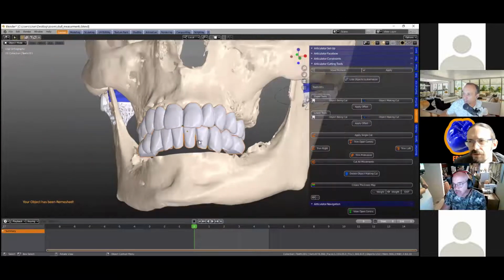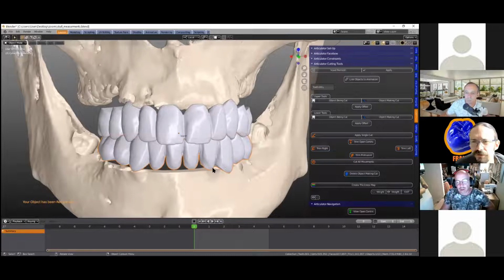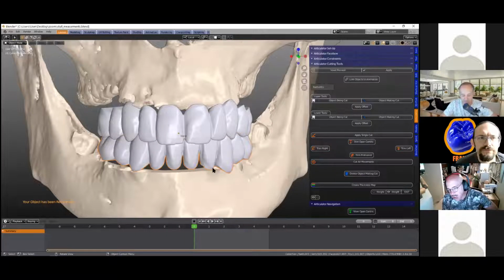So I'm going to do the same thing for the lower, voxel remesh it, and we're going to lose the quadriflow remesh apply button now. The quadriflow remesh, I found, sometimes gives problems with users. It takes so long to implement sometimes that I think we should rather stick to the voxel remeshing. Yeah, and I think it is reliable, if you know what I mean.